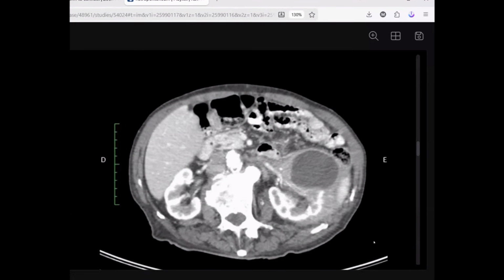I didn't hear you well, please. Can you please repeat again? What's your differential diagnosis in this case? Yeah, it could be perinephric hematoma, but I would like to see the unenhanced images as well. Okay, very nice. You should review the non-contrast study to check whether it is hematoma or not. Okay, what else?